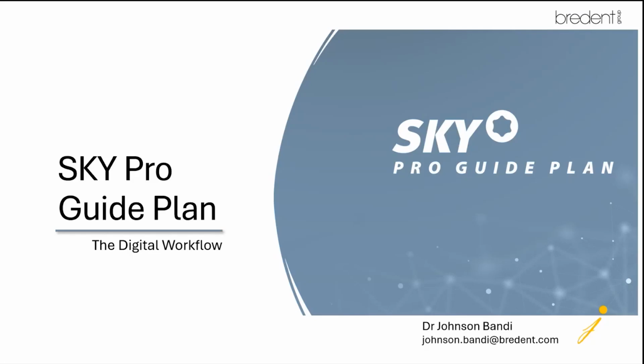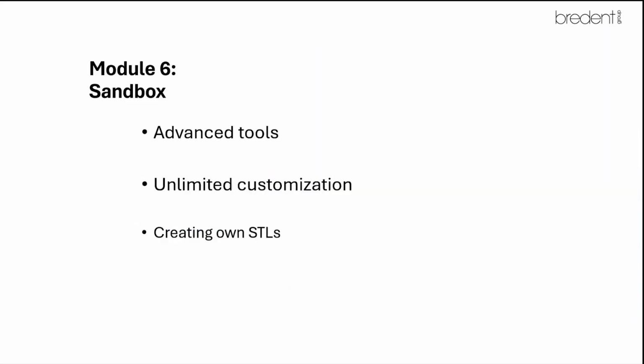In the previous module, module 5, we covered different varieties of surgical guide, including the stackable guide, bone reduction guide, and everything. Today's session is about Sandbox. It can be called an entirely new or different software altogether. It has too many options and a lot of advanced tools. You can customize any kind of STL format in it, and you can make your own STL format.